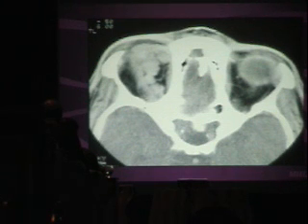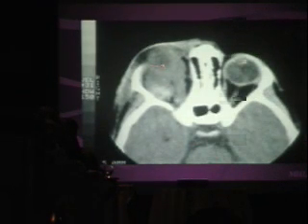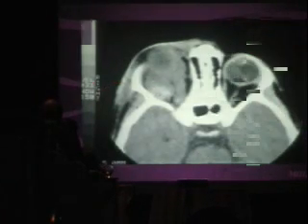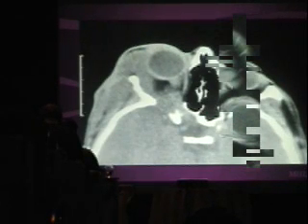Something else important to keep in mind about lymphangiomas. Much more common than other lesions to bleed or calcify. And again, because they have that venous association, because they're at that end of the spectrum of those lymphovenous malformations. So the last image was with contrast, and you can see there is some hemorrhage when you get the image without contrast. And this was a big lymphangioma that went through all these different spaces.